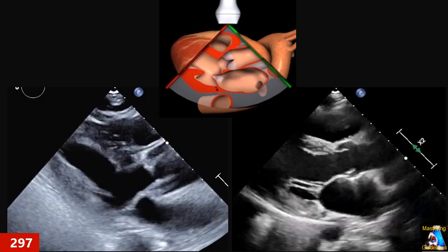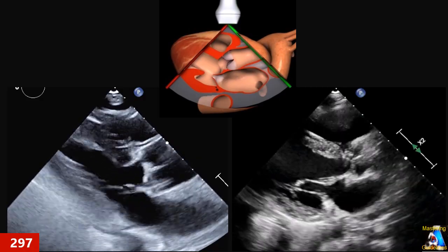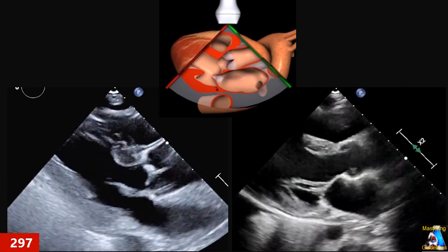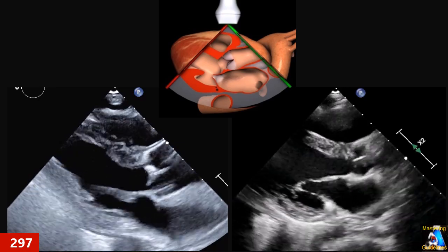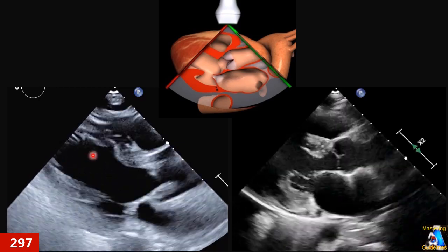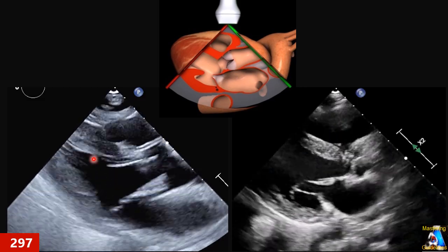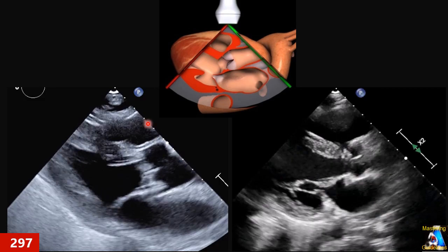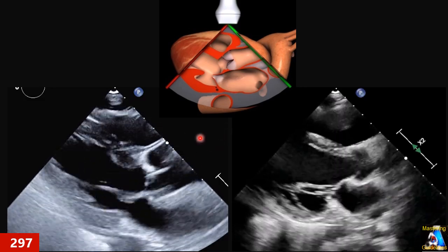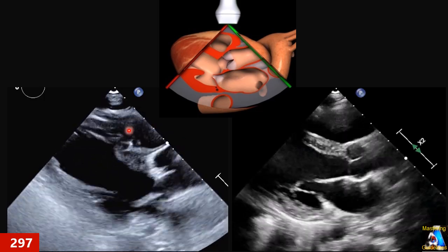Hi everyone. There was a good question from one of the members, and the question was: is it correct that on our PLAX we can see all of the left ventricle like this one? Is that correct or not? Before I answer this question, yes or no, I have to clear one general principle in ultrasound.